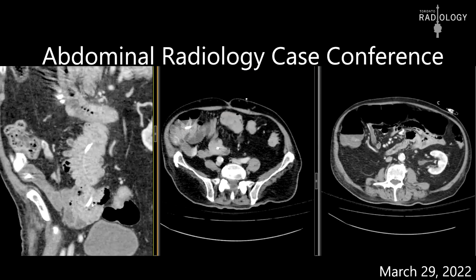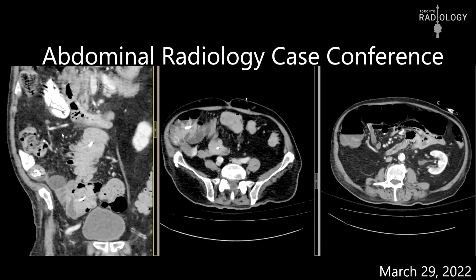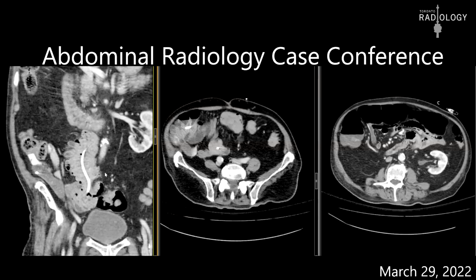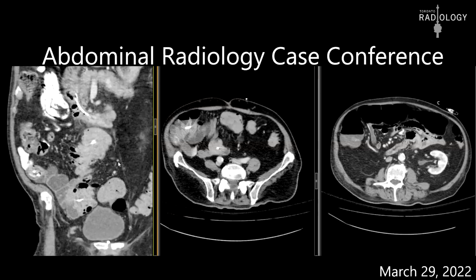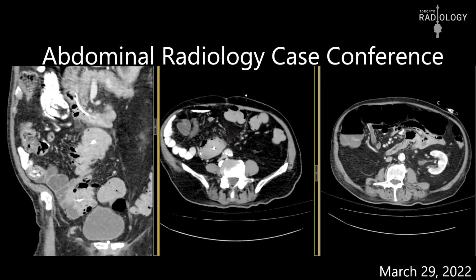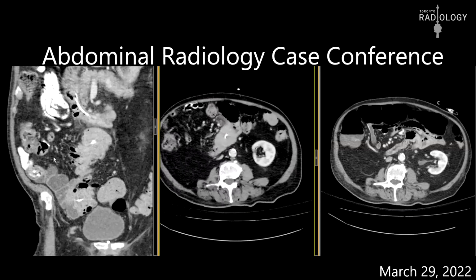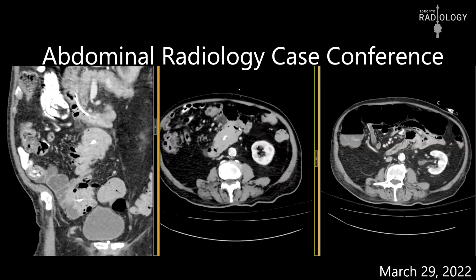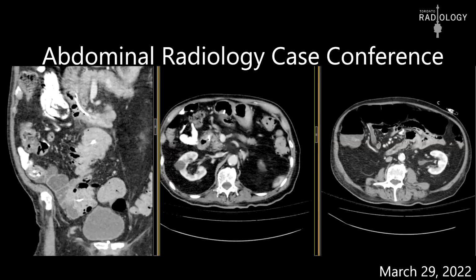So what they did is that in the first patient, the patient didn't want any treatment and she left. Whereas in this second patient, they tried pulling the tube out and they couldn't pull the tube out because obviously it's just stuck with all this bezoar. So instead, what they did is they cut off the proximal portion of the tube here.